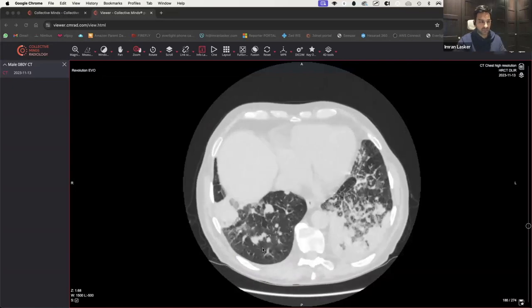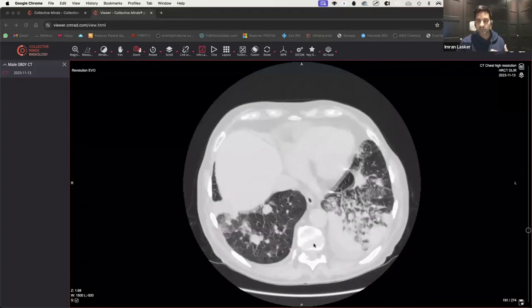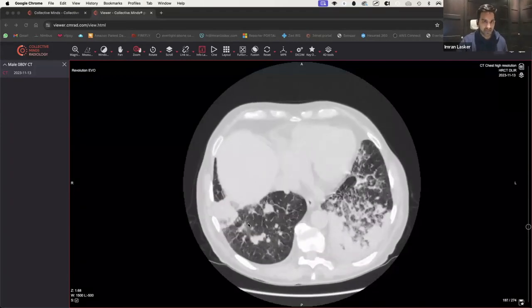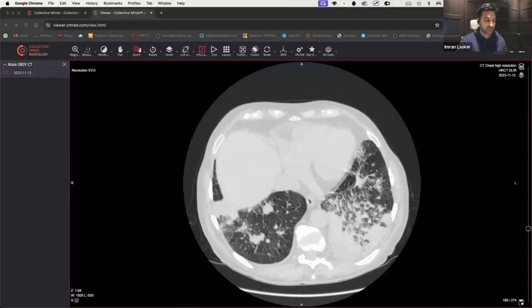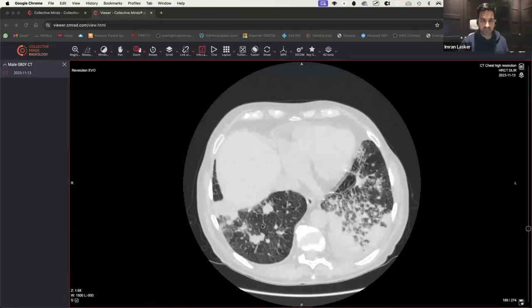It looks like they've got quite significant consolidation. So someone's done really well there, and you also start to wonder, okay, is there something else going on? Because you do have extensive consolidation, but some of these don't really look like focal consolidation, because normally with consolidation, you get wavy, irregular shaped things, but some of these actually look a little bit circular. Right.